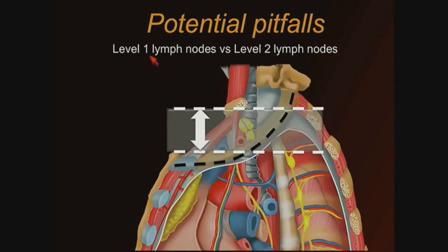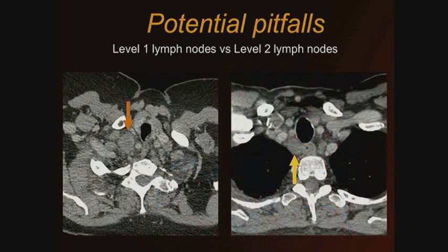And it actually makes a difference, because if we say that the patient has level 1 lymph nodes, which are lower cervical, we're saying this patient has N3 disease, which puts him in stage 3B disease, which implies chemotherapy. So there's some impact on what we're saying. Let me show you in real life how this looks.